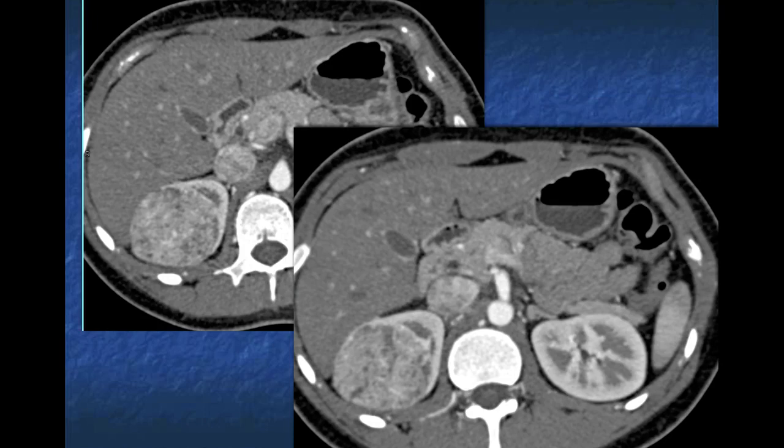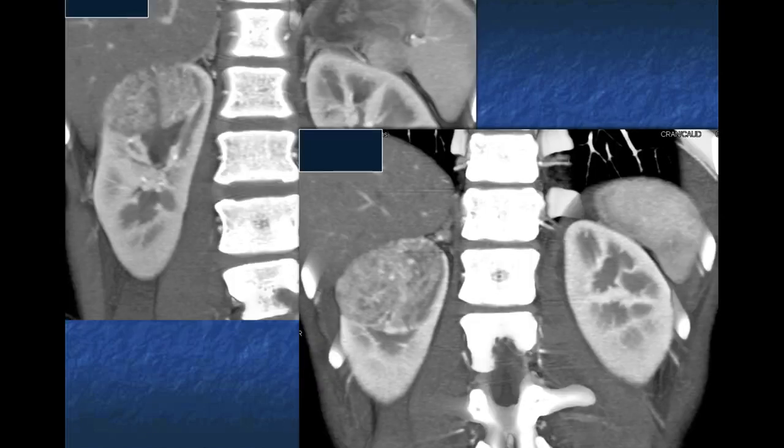It's vascular. And you're trying to say, well, what could it be? If the patient had sickle cell trait or sickle cell disease, you get medullary carcinomas. They're rare. They're also very aggressive and have mets. Here I just see the solid mass. It's vascular, so it's not an angiomyolipoma.